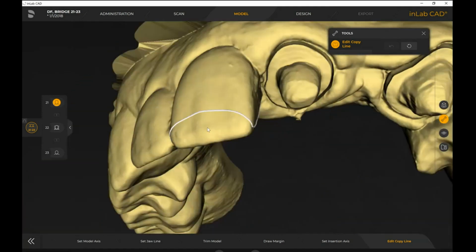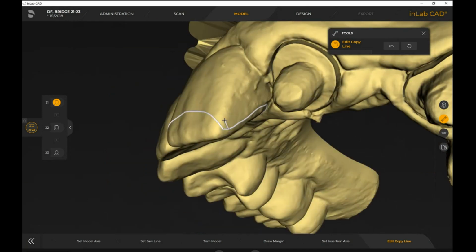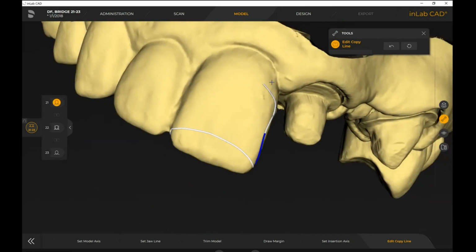So the lingual, obviously, can be helpful for when you're dealing with the bite, if the bite is ideal for the adjacent teeth, but more so you want to focus obviously on the facial aspect of the teeth to ensure that it gives the best possible result from an aesthetic quality perspective, so that it again has that symmetry where the anatomy is concerned.